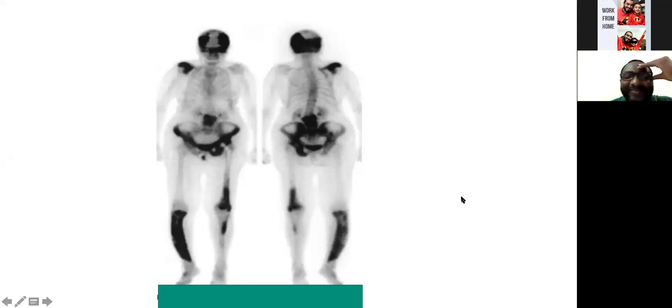Thank you for your nice presentation. I'm presented with a whole bone scan, anterior and posterior view, for an adult patient. There are multiple areas of hotspots at the proximal right femur, right tibia, and the distal left femur. There is also a small area at the proximal left tibia. The pelvic region is also showing areas of increased uptake. There are also areas of uptake at the proximal right scapula and skull. In summary, multiple areas of hotspots with expansion of the bone involving skull, femur, tibia and pelvis, representing polyostotic Paget's disease.